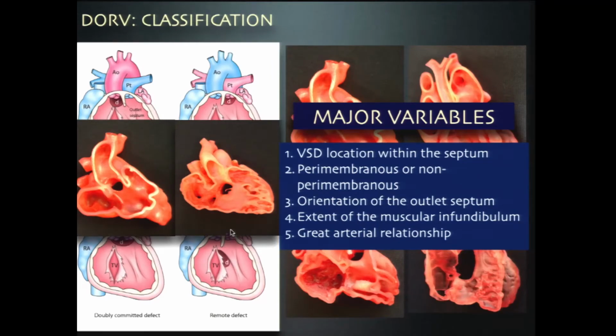So here is another case. Here, this VSD, the aortic valve is very close. However, this VSD is half outlet, half inlet. It's not completely inlet. Why? How do I know? This is the medial papillary muscle of Lancisi in the middle, so therefore this is a confluent outlet and trabecular extended, inlet extended VSD.